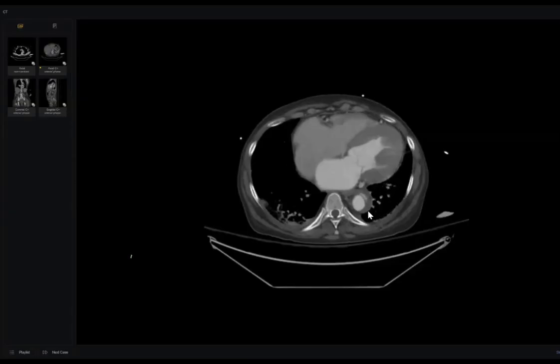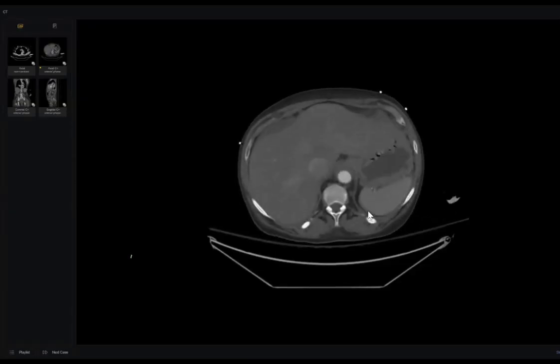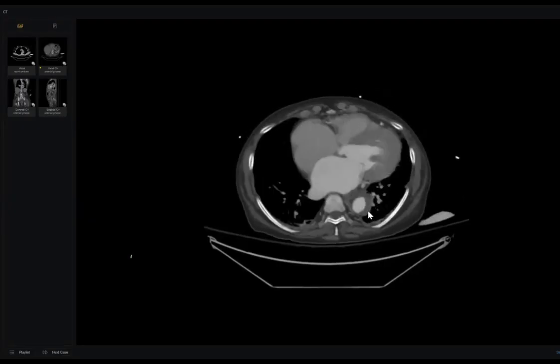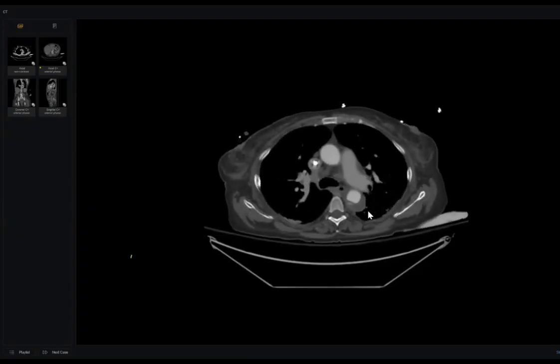I cannot see any significant calcification, but there are some ulcerations noted. Okay, but there are many tips here. See, here, the thickening starts almost posteriorly.